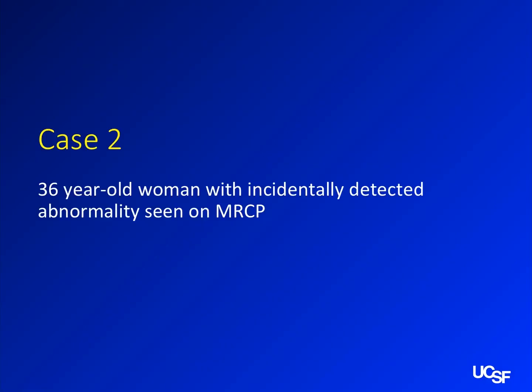Another case. This can be a first-year case too. I can take it. It's a 36-year-old woman with an incidentally detected abnormality on MRCP.